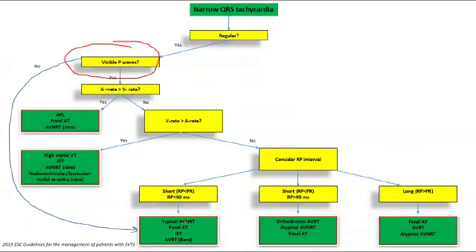Sometimes the P waves become embedded into the QRS complex such that you can't even see them. So that's why it's also important to have the ECG in sinus rhythm, so that you can compare your QRS morphologies, because you'd find that you have some notches which are suspicious of P waves, but you can't be sure until you compare your ECG with your normal sinus rhythm ECG.